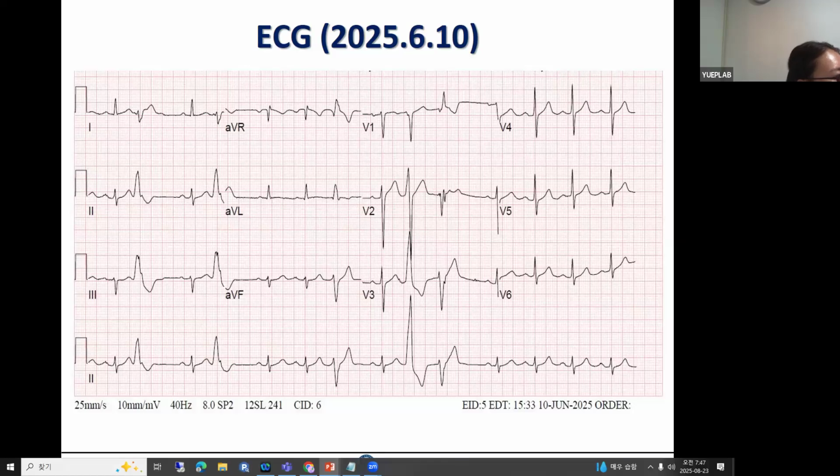Based on that, what do you think, is this an older guy or a young guy, age-wise? Is this EKG of a young person or an older person? We can ask AI. No, don't ask AI. Younger people tend to have more sinus arrhythmia than older people. So this is probably a younger person rather than an older guy. That's what I would favor.